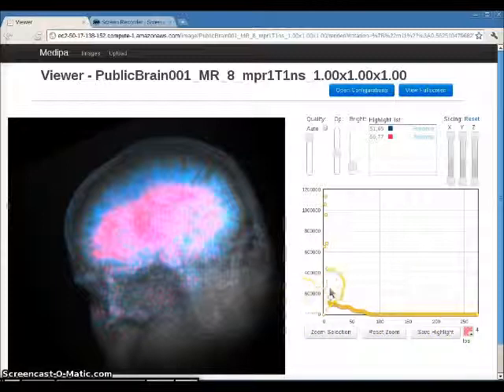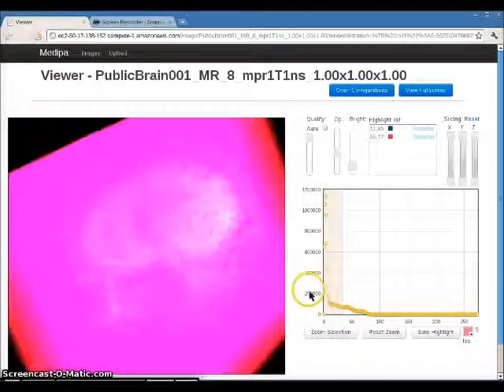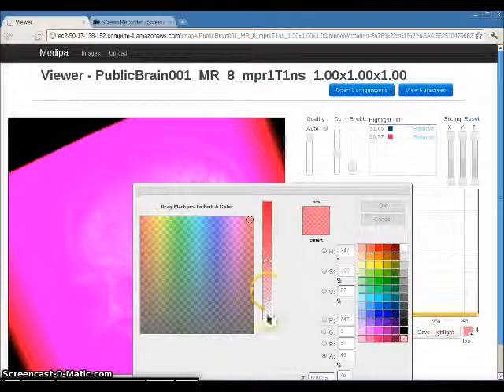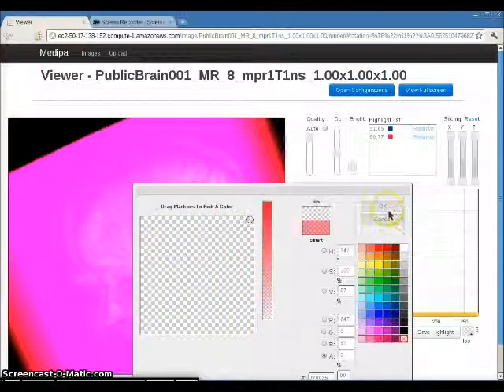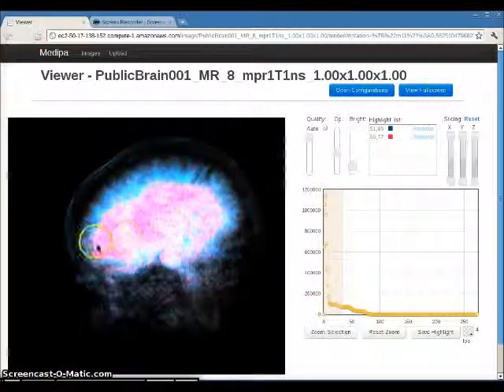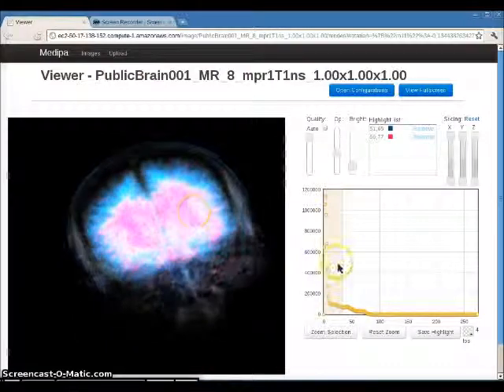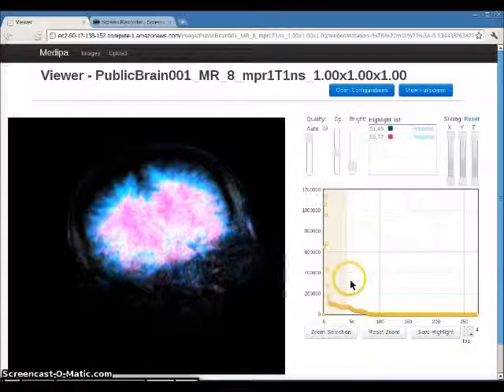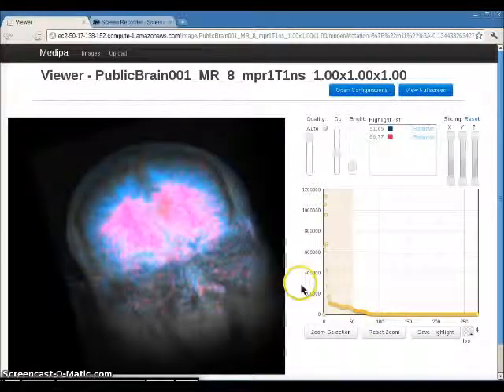And since this also allows for the alpha channel to be selected, it means we can hide things. So for example, I'll highlight the majority of the head, and if I set it to an alpha 0, it basically disappears. And you can play with each color sort of before you actually save it to the list.